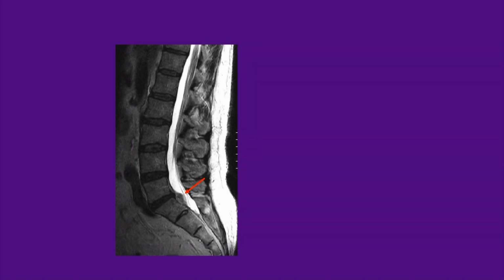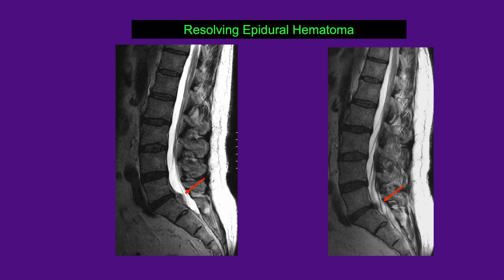One mimic of disc herniation or sequestered disc is seen in this case, with signal intensity material posterior to the L5-S1 segment, somewhat hyperintense and lenticular in shape. This was felt most likely to reflect an epidural hematoma, and over time was seen to resolve and shrink in size.